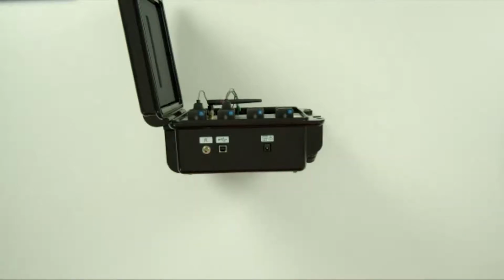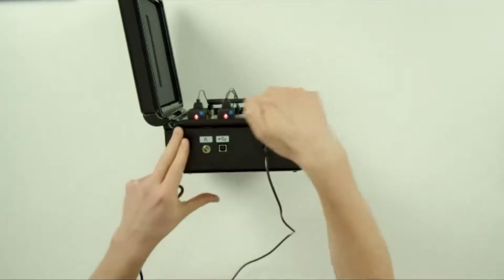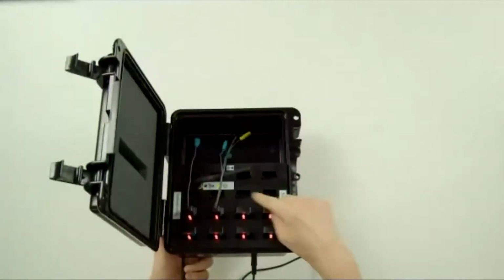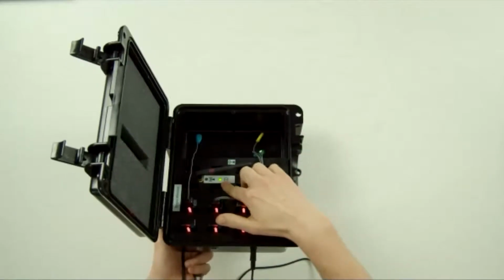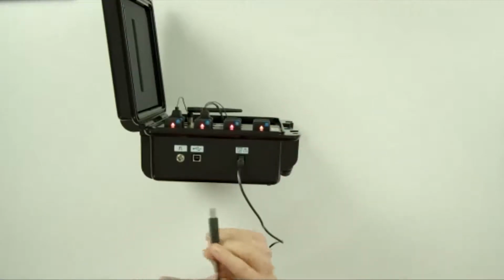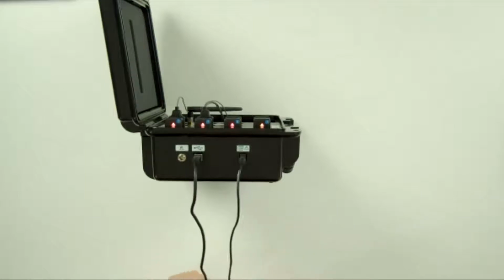So let's start by connecting the power to the Trino base station. When we connect the power, any sensors that are docked inside the charging docks here should illuminate, and we should see the indicator here that shows that it is powered and operational. Next step could be to connect your USB, one side into the base station, one side into your computer.